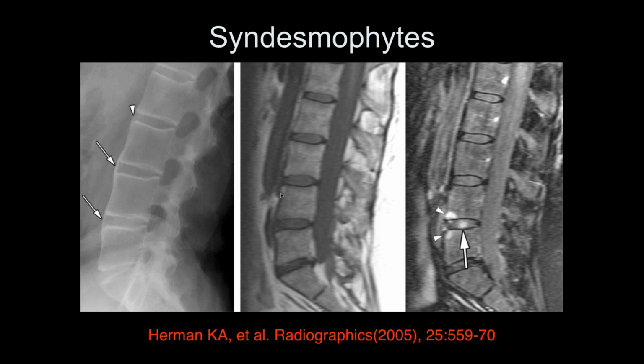Can't really see the syndesmophytes very well at all on an MR examination. What we see are the shiny corners that should make us suspicious. Again, most early degenerative changes are here in the center. When they're on the edges like this, because these are Romanus lesions, be concerned about the possibility of inflammatory disease. To be honest with you, if I just saw the MR scan here, since this is only at one level, I wouldn't be as suspicious as maybe I should, even though this patient has long-standing ankylosing spondylitis, because the patient already has syndesmophytes which have formed.